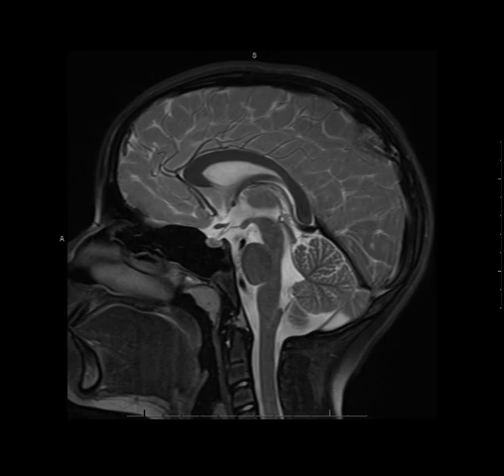Some vascular anatomy that you can see on the midline sagittal image includes the superior sagittal sinus, which is the big vein across the top of the head that extends posteriorly to the region of the torcula, which is also known as the torcular Herophili, or winepress of Herophilus, or the confluence of sinuses. Also on the midline image we can see the straight sinus, which also drains to the torcula. Just adjacent to that, and just inferior to the splenium of the corpus callosum, is the vein of Galen, and then what is draining into that are these paired internal cerebral veins.